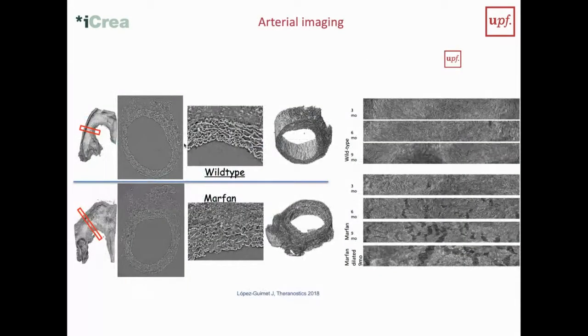Here you see an example of a vessel wall, in this case an aorta, being imaged, where you can nicely see the elastin fibers, the ones that cause the elasticity of the wall. As I said before, the vessel wall needs to be able to expand when needed, but it also needs to be elastic, because with every heartbeat the blood is pushed into the aorta, which expands a little bit in order to buffer the pressure wave of the output.